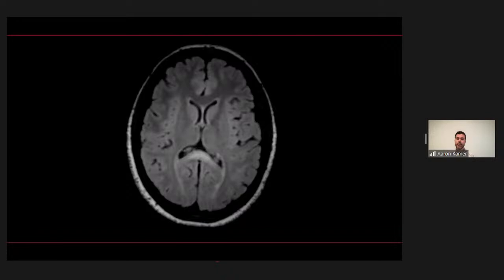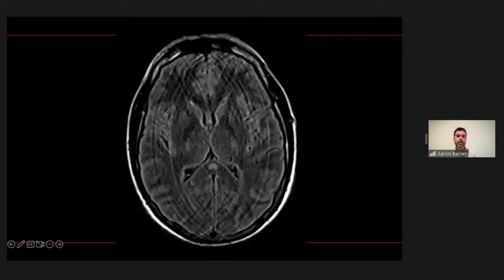There are a number of other things that can cause these lesions as well. One of the other big ones is chemotherapeutic agents, and there's a long list of things that can do this. But in the setting of epilepsy, think strongly about a patient who recently stopped their meds. Nice. Here's another example of one that's a little bit less extensive. You can see that small lesion right in the center of the corpus callosum in a different patient, if you can read through all the motion.